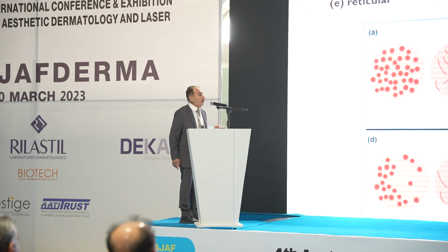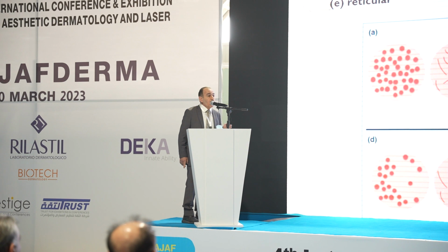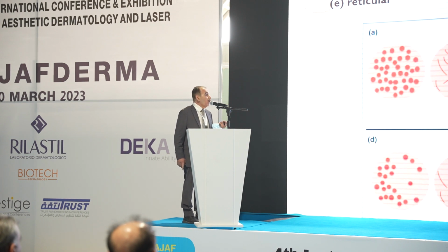This occurs in some diseases like mycosis fungoides. Or the distribution is peripheral, only in the periphery of the lesions, like that one on the B. Or the distribution could be clusters, like number C.